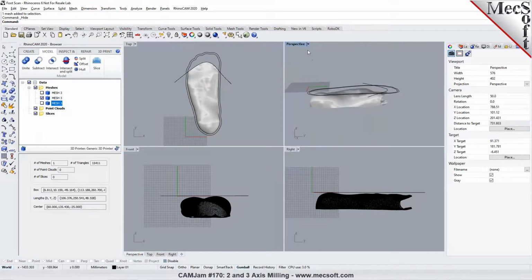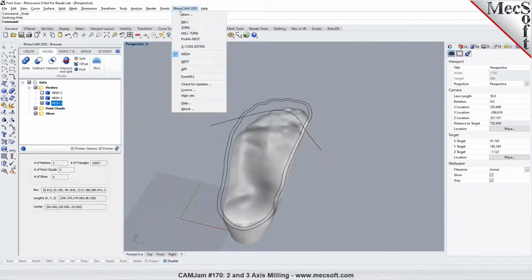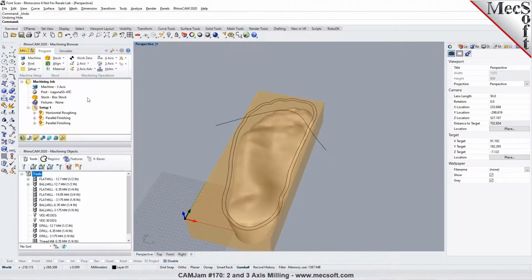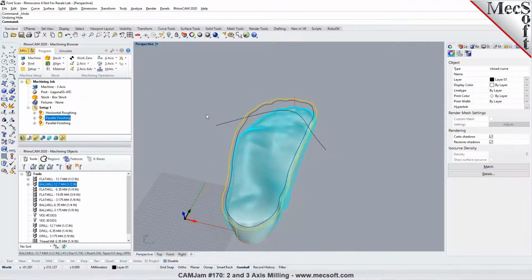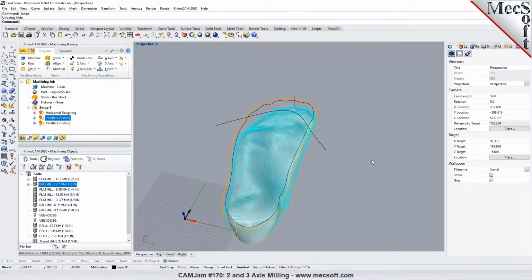So you have a wide range of tools available for editing and also machining. Now, if you feel that just a parallel finishing cut pattern, the toolpaths you're seeing here, is good enough, then that works. If you would also like the ability to do some advanced 3D machining toolpaths, then the Pro would be ideal. If you're just going to be using parallel finishing, then this can be done with the standard configuration as well.